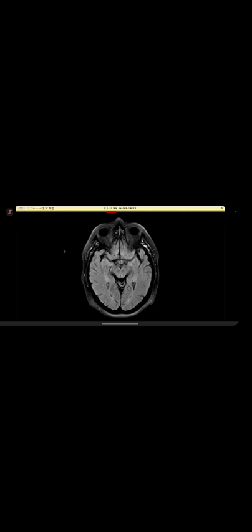Okay, so I'm provided with FLAIR axial sequences of the brain. So this patient has presented with tinnitus. Are you doing it intentionally?